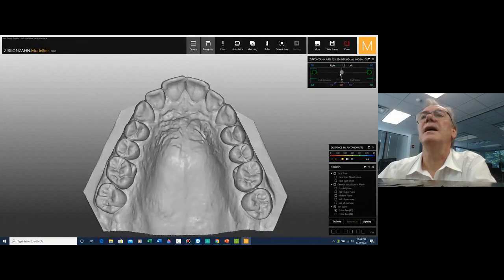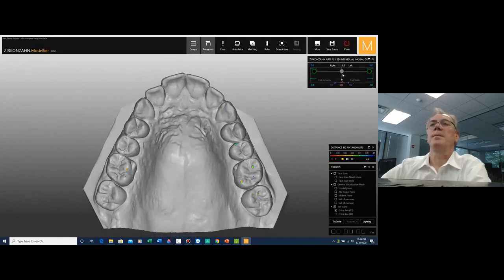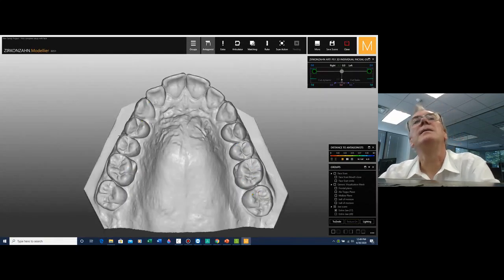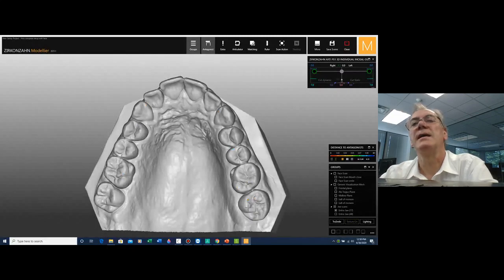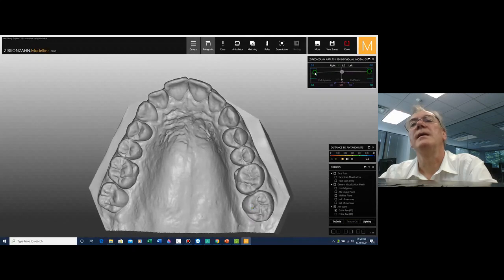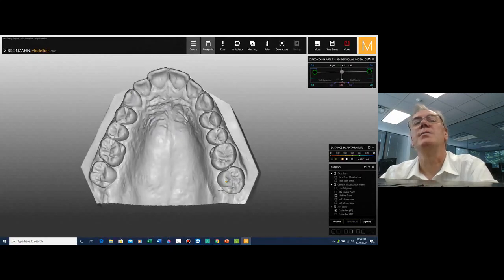So we do need to evaluate what we are going to perform on this protrusive movement and how we can diversify. So we take the lateral movement, which is 1. In the first millimeter, the canine actually moves out of position, loses its contact, and the contact persists on this molar. So it's 1, 2, 3, 4, 5, 6, 7, 9, 10, and it goes all the way until the canine captures that movement one more time. So what happens if we eliminate this contact and see how this canine is going to behave during this movement?